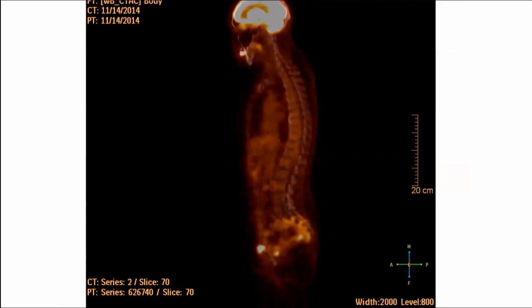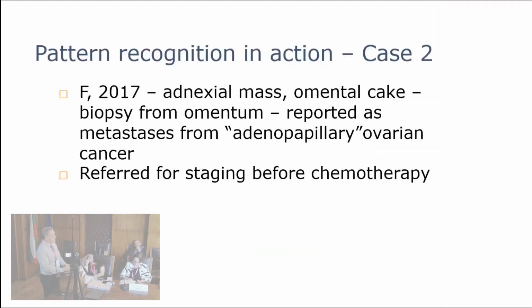What you see here is perineural invasion through the sacral foramina. That's why the patient has such severe pain. So in patients with severe pain symptoms, think about perineural invasion. You don't think about it in serous carcinoma, but you should think about it in squamous cell cancer.